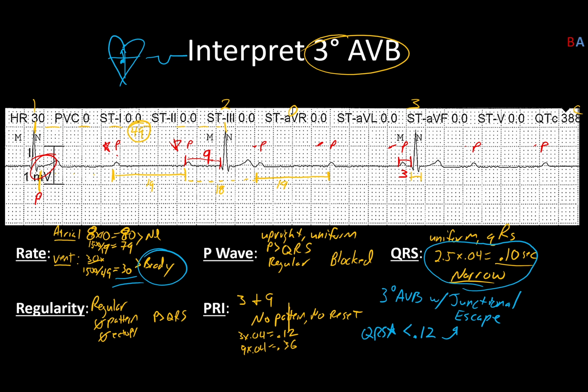The one that's upside down. But in third degree heart block, this has been severed. There is no retrograde conduction. Therefore, you'll never see that quote unquote upside down P wave, meaning you just get a QRS all by itself. Meanwhile, the atria is doing its own thing with its upright P waves like these guys here. So that's the reason why you won't see those.